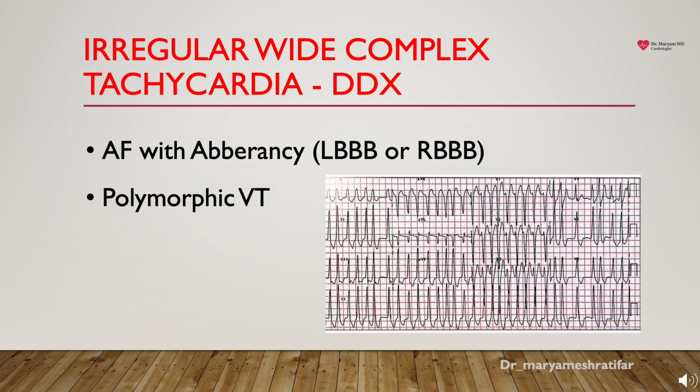If a baseline ECG is not available, another helpful clue is the presence of QRS complexes with a uniform morphology, because when the impulse originates from a supraventricular source, the QRS complexes tend to look similar. In this ECG, however, the QRS complexes are not uniform, which makes this diagnosis less likely.